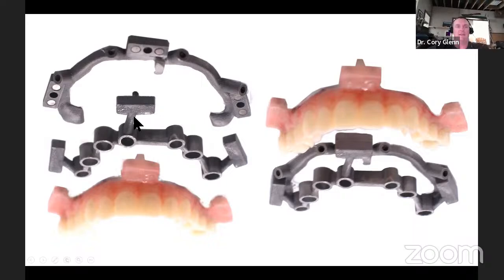Once he's done that, he can take the stackable drill guide, and this will stack on. You can see these are all magnets. So I actually have 6 magnets here, which is about, let's see, that's 12 total magnets at like 1 pound a piece. So you have about 12 pounds of retention between these objects. I mean, they're really on there. And then these little pegs are what orients it and eliminates any potential of side to side or front to back movement. So the magnets provide retention. The pegs are providing the indexing into position.